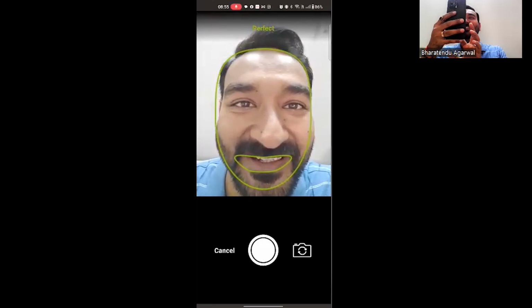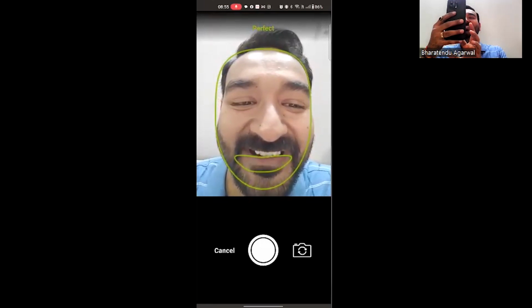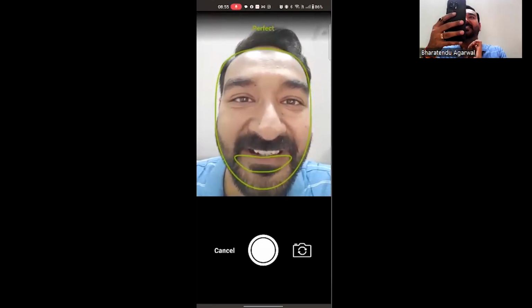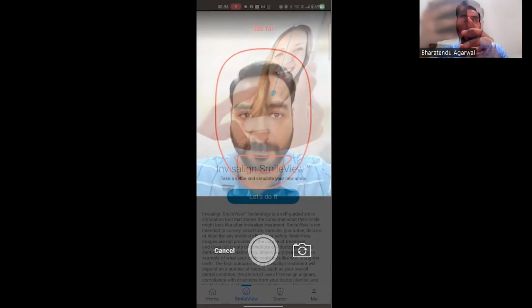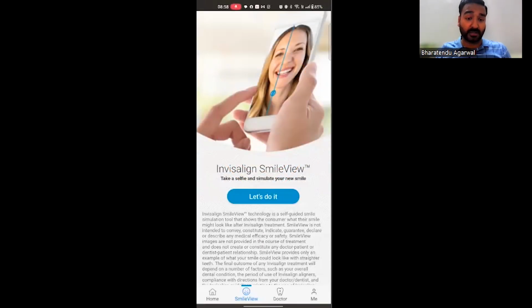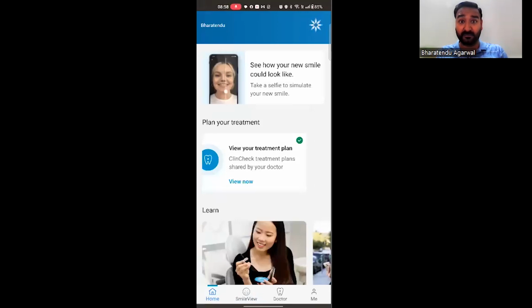All right. Let's click. Oh, this is a really random picture. Let's retake the photo. All right. So this didn't work out. So we'll just move on because it doesn't like my face, as you can not be surprised.